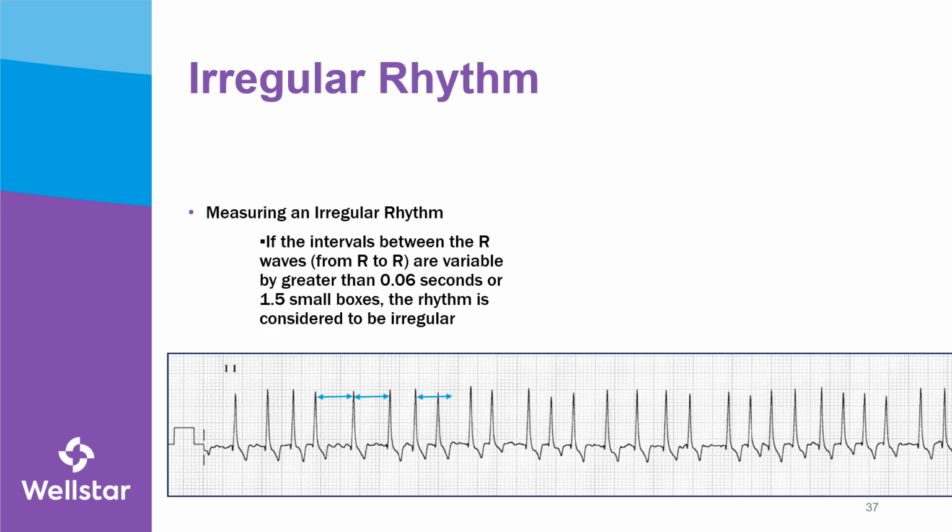With the trained eye, you can see that a lot of these QRS complexes vary in distances pretty frequently, and just from my experience, knowing how irregular this rhythm is and the absence of discernible P waves, I would say that this is AFib, rapid AFib, or AFib RVR.